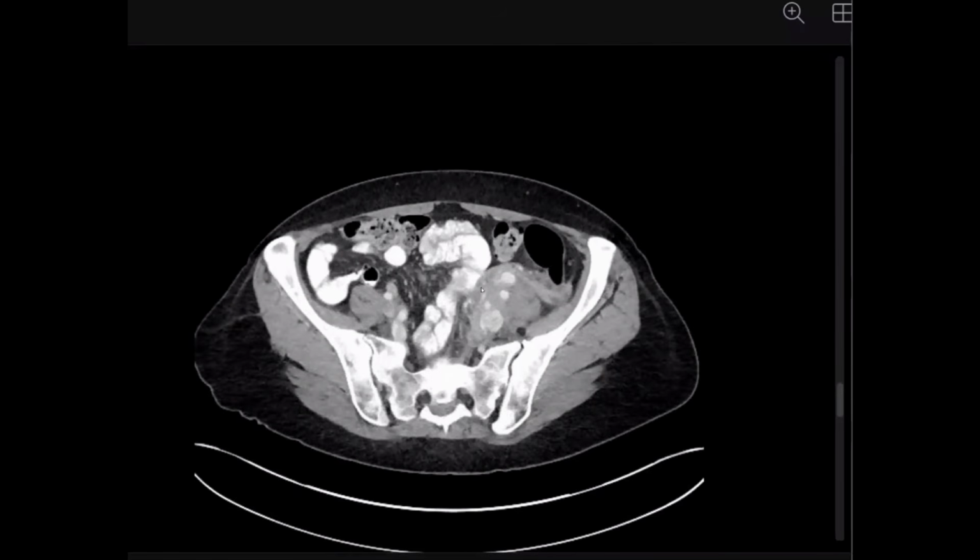What is this plane? Do you know the name of this plane? What is the name of this plane? This one. Let us see. I don't know. Okay, so I think it's in the pelvis plane. I don't know, sir. This one is called the combined interfascial plane. This is a combination between the anterior renal fascia and the posterior renal fascia that we described before.